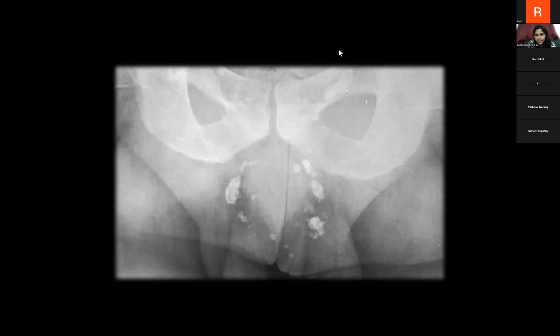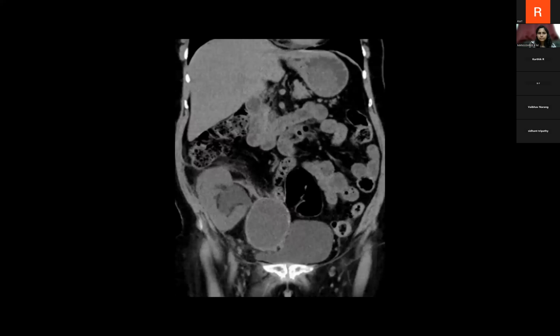Someone asked, why can't this be calcification of sebaceous cyst? Yeah, this can also be a sebaceous cyst. Scrotal sebaceous cyst also, but the possibility of this being pampiniform plexus calcification is more likely than sebaceous cyst. So phlebolith of pampiniform plexus is more common than the sebaceous cyst here. So we go with pampiniform plexus calcification. Next spotter. Starts now.